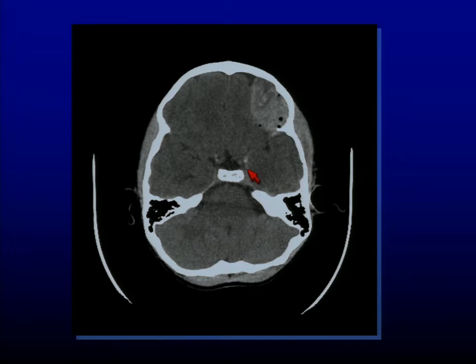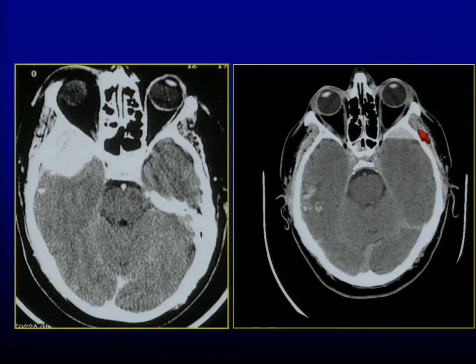So here's another place you can hide it. Again, it doesn't have to be that middle meningeal artery. So here's one that got between the coronal suture and the frontal suture up here. Again, it's just a collection above the dura of blood. You can see some air density located within it also, so you know there's a skull fracture associated with it. You can hide them up in the temporal tips. You can have epidurals in the temporal tips, either side.